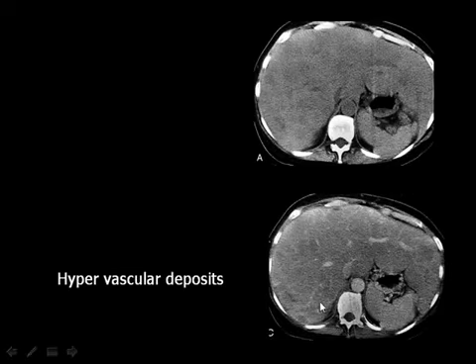And here is an example where you can see that the liver is markedly enlarged. This is the pre-contrast study. No contrast is seen in the aorta. After injection of contrast, you see the aorta is opaque. Then, what is the difference between this and that? Can you see focal lesions in the liver in the pre-contrast study? You may be able to say, yes, this is one, this is one, this is one.